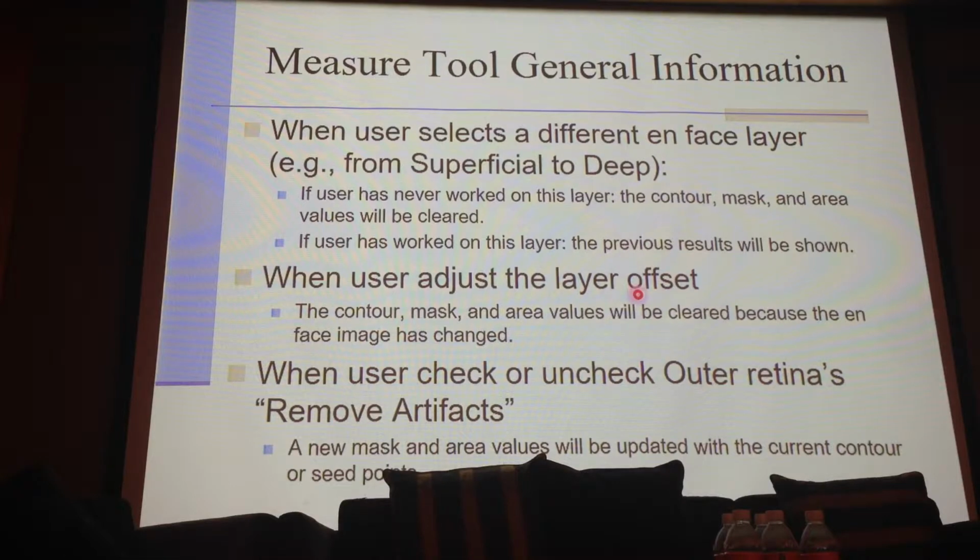So generally, we need to set different offset layers for individual scans. And whenever we adjust the layer, no matter if it is offset, depth or thickness, the number will be cleared. So we make sure we click the save button. All right. Okay. Now here's a small investigation.